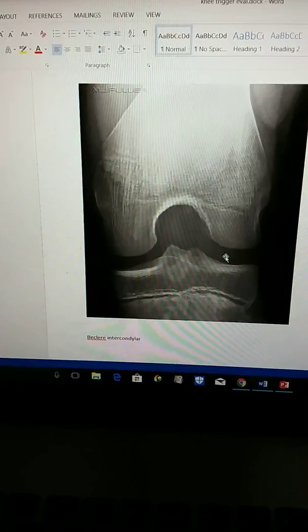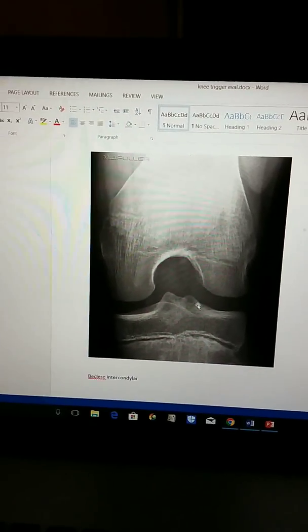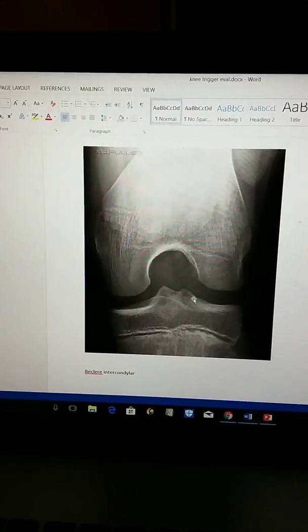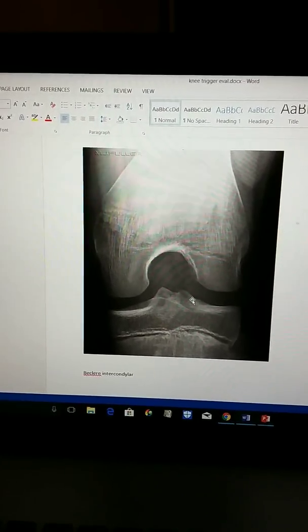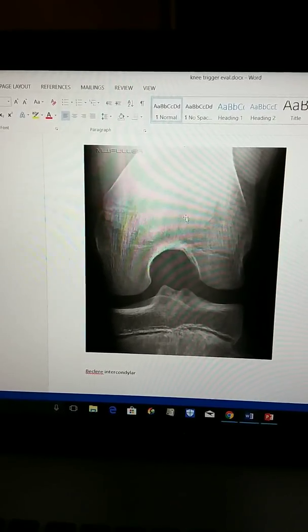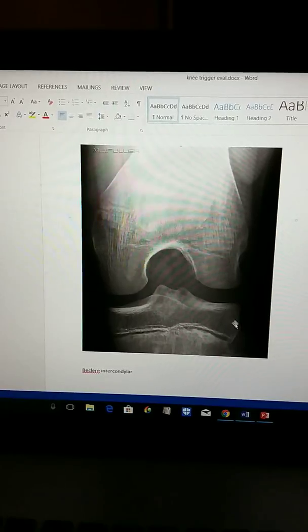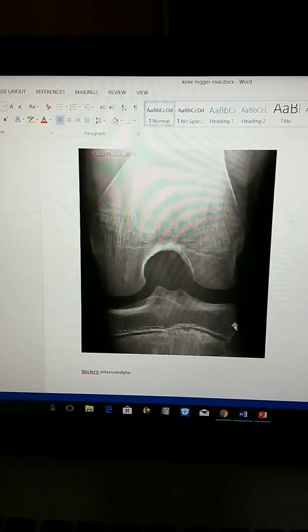The intercondylar eminence and knee joint space is visible here. No superimposition of the fossa by the apex of the patella, and no rotation as demonstrated by the slight tibiofibular overlap.